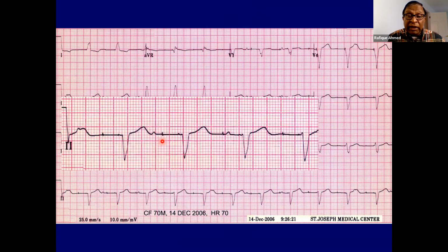Now, this atrial pacing spike, there is no P wave. By this alone, I cannot tell that there is failure to capture, because if there is a P wave and it paces immediately after the P wave, it can be refractory. So this one tells me there is failure to capture the atrium, and this one tells me there is failure to sense the atrium because it should not have paced here. It should have seen this. And if it had sensed it, it would have paced the ventricle synchronized. So it is not seeing the P wave at all. And this is probably random, because this P wave and this P wave look like just random atrial pacing. I don't believe this. Again, you can see this one did not capture.